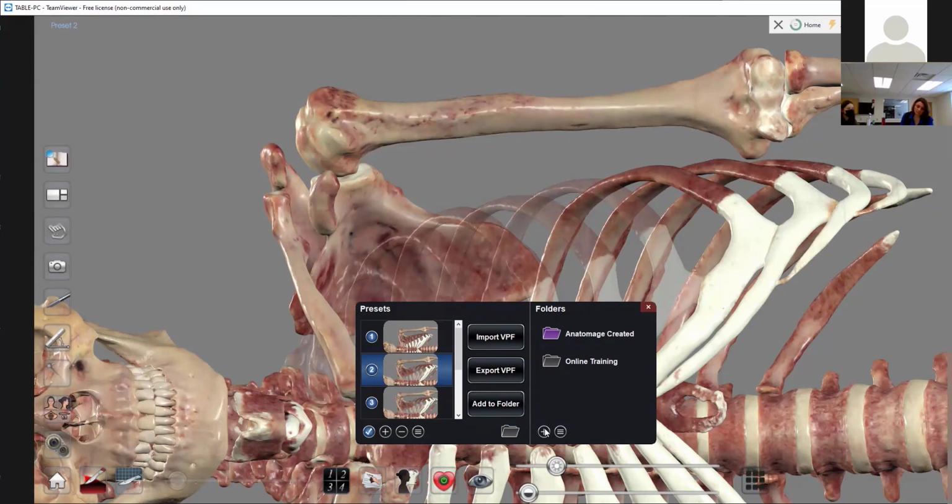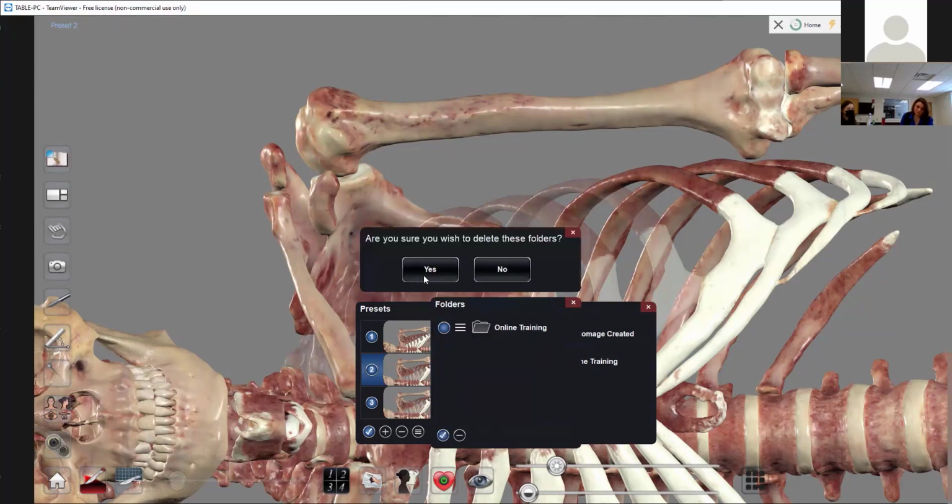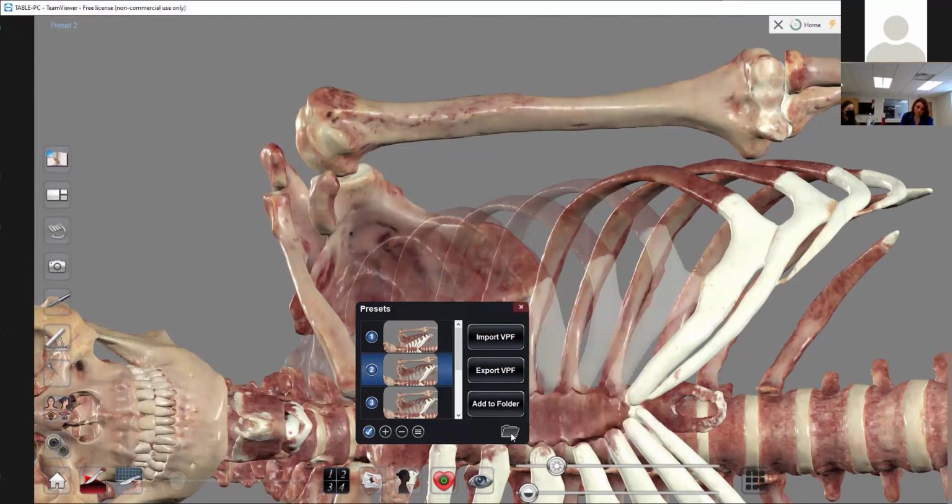If that tracks. So I will delete this. What we can also notice here, well, I guess any questions about saving or exporting presets or how to save your work? No, it's pretty good. Thank you. Good. Sweet.